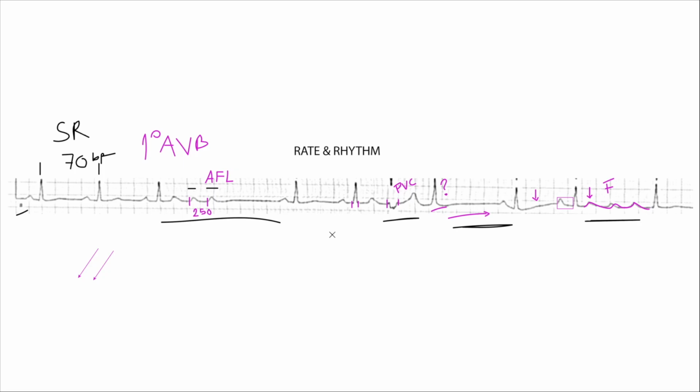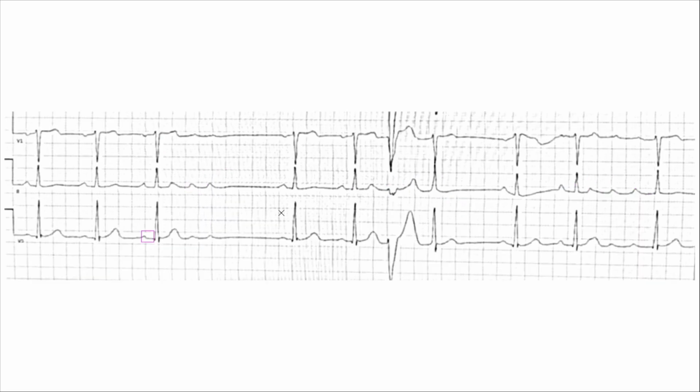This patient was seen in the ER. A 12-lead ECG was taken. I have no demographic information about this patient. I know the patient was symptomatic. I don't know the symptoms. Now let's keep moving. Okay, so this little box here remained. Doesn't matter. What do we see here?